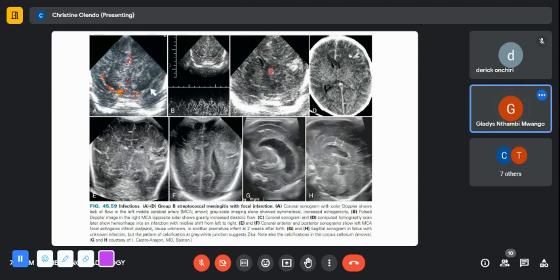And those thalami are looking quite enlarged. The basal ganglia, you cannot see, normally you should actually see the internal capsule. So the definition of the different nuclei within the basal ganglia, you're not seeing them very well the way you normally would. And the same features are again better shown on the CT. You can still see the hemorrhage, the loss of definition of the basal ganglia, the diffuse brain edema, the midline shift. All of those are being shown very well.